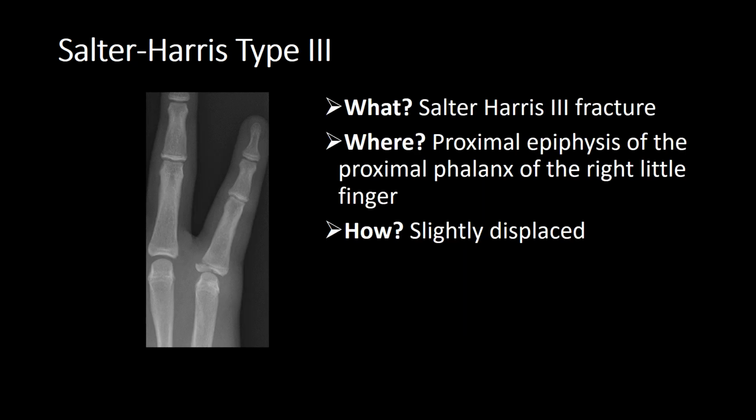So what is it? It's a Salter-Harris 3 fracture where it's the proximal epiphysis of the proximal phalanx of the right little finger. How? Slightly displaced.